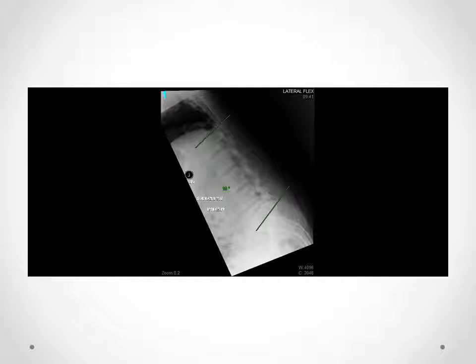So now in moving this injured worker into full lumbar spine flexion, the lumbar lordosis reduces to minus 10 degrees, a change of minus 60 minus 10, which is 50 degrees. So we've lost 50 degrees of lumbar lordosis in moving from neutral lateral to full flexion.